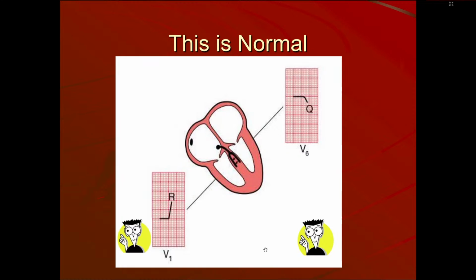And this is also important. You can get a short note. Why is a small Q wave in the lateral leads normal? V6, lead 1, AVL. Why is there a small Q wave? What is it because of? And why is it normal? Because the small Q wave in V6 or lead 1 denotes the depolarization of the interventricular septum.